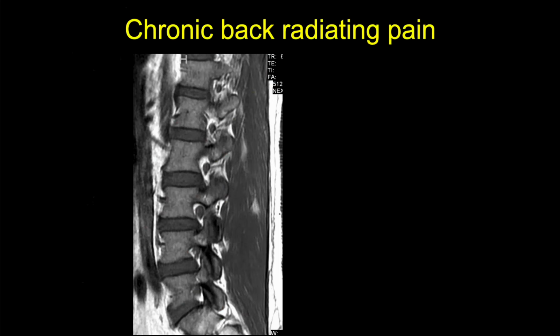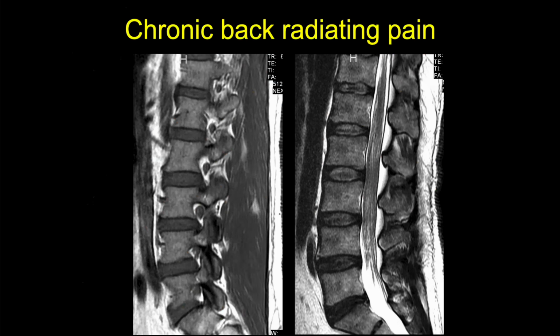Okay. Dan? Chronic low back pain. So, sagittal view. Posterior elements. Okay. Nerve roots look okay. Maybe a little thickened. Okay. Here's the sagittal midline cut.